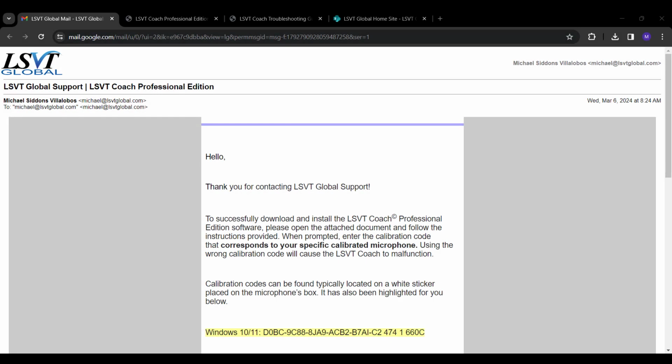Throughout this LSVT Coach video tutorial, we will walk you through the installation of the LSVT Coach together. We will be showing the LSVT Coach Professional Edition installation. However, the installation of the Client Edition of the LSVT Coach is more or less the exact same. A quick mention before we begin, you must have full administrative rights to the PC that you are using. If you do not have full administrative rights or are uncertain, please contact your internal IT representative.